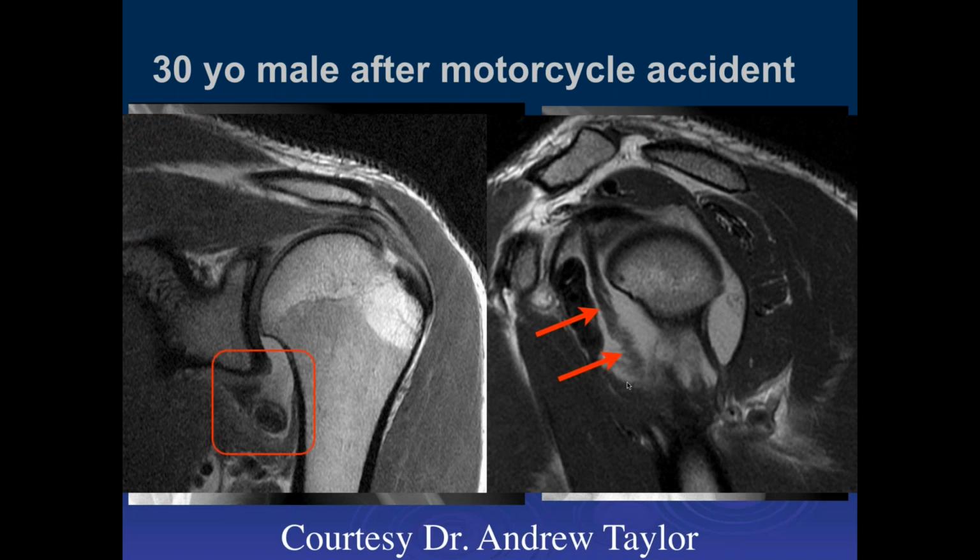That could have injured one of the glenohumeral ligaments or the labrum. In this location, it attaches up here, right? So this has got to be either the middle glenohumeral ligament, which is torn, or the superior insertion of the anterior band of the inferior glenohumeral ligament, which is torn inferiorly here. We'd need the other images to sort out which of those two it is. And this is probably a loose body down here. Have to look for a donor site in that patient.